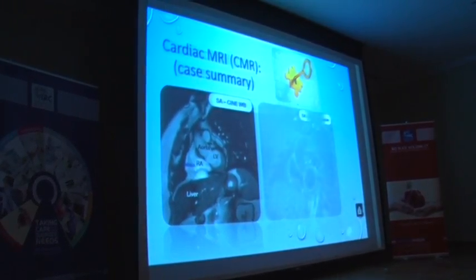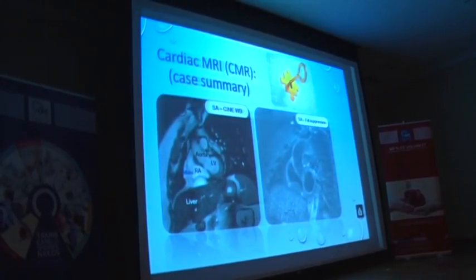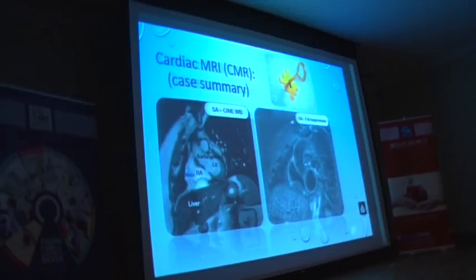Then we performed fat suppression, and this is the lesion after fat suppression. A lipoma. Yes, excellent. Okay, two gifts, no problem. So it was an extracardiac lipoma.